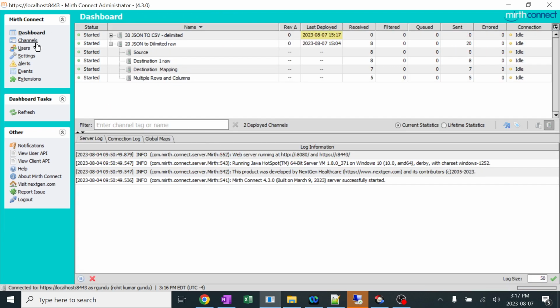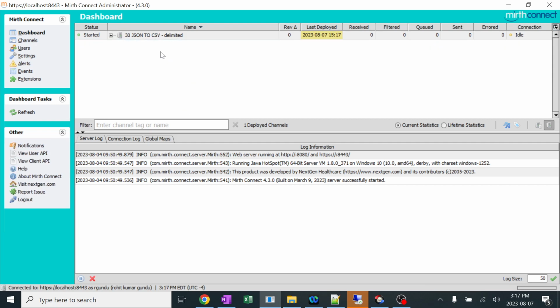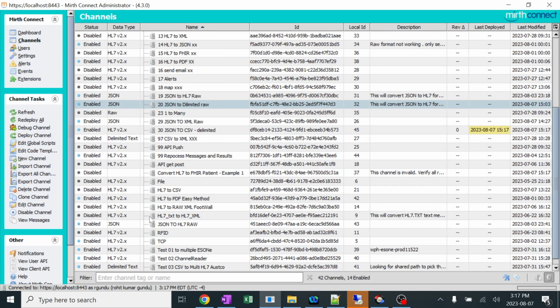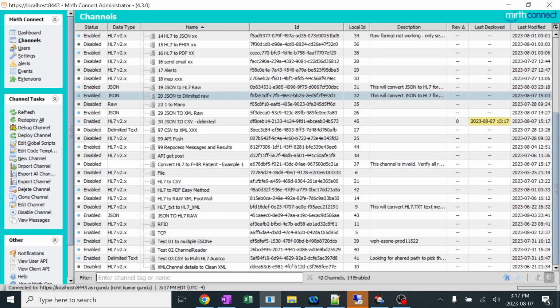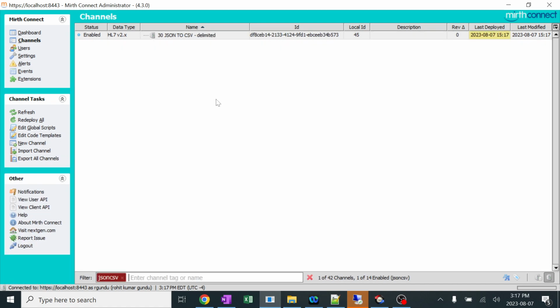I'll click save and deploy this channel. As I do regularly, I want to undeploy everything, but only work on what we are working on. It's clean and neat, right? Even the channels, I want to remove everything. So I'll click on JSON to CSV. That's it. We are on a very neat and clean screen, and we'll start working on it. Ignore, I have a cold, so my voice would be a bit different.